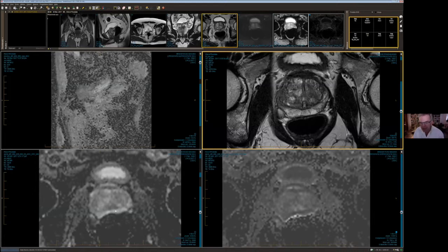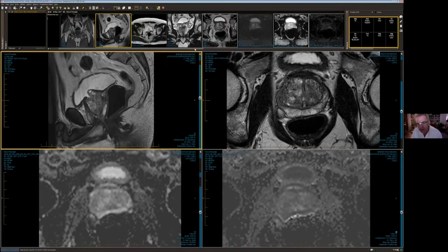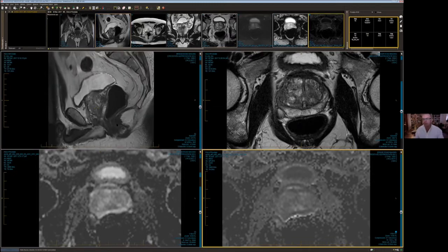Posterior TZ tumours are extremely rare. I'd need some convincing. And tumours around the urethra, particularly, because that's where TZ growth occurs. So you've got very young tissue there, which has hardly had time to develop a cancer, unless there's been some extraordinary mutation that allows a very rapid growth of cancer. Lisa, I agree completely. I think most of the transition zone tumours are anterior or anterolateral at worst.